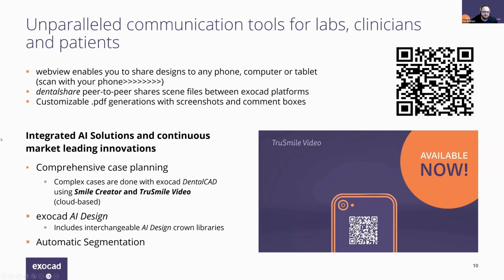We see this utilized a lot in the clinical world, where they might have our software to take care of the simple cases on their end, or they want to collaborate with a laboratory, a design center, or a milling facility. It's a simple left click to send a case and choose who you're sending it to, and then pick what service you want, whether you want design only, design and fabrication, or production only.